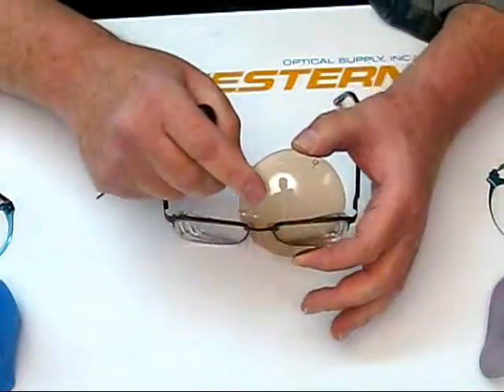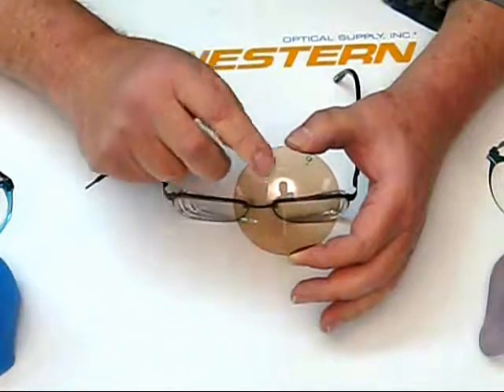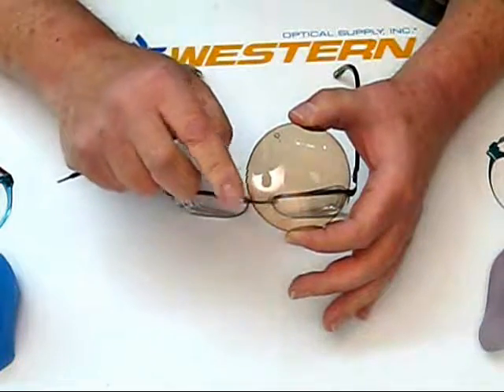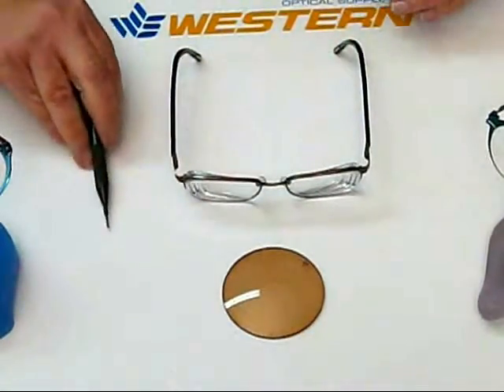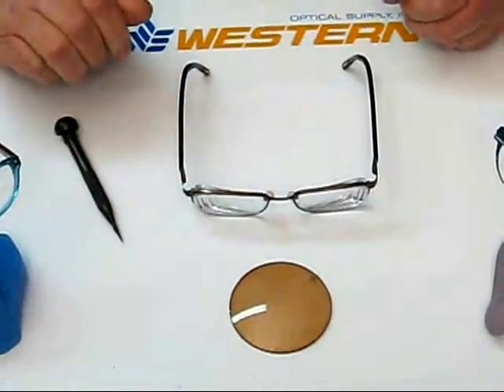So the front of a lens is called the plus side or the convex side. The back of the lens is called the minus side or the concave side. So those are the terms that you should become familiar with, so that reading about how the tools function in the catalog will become a lot clearer to you.